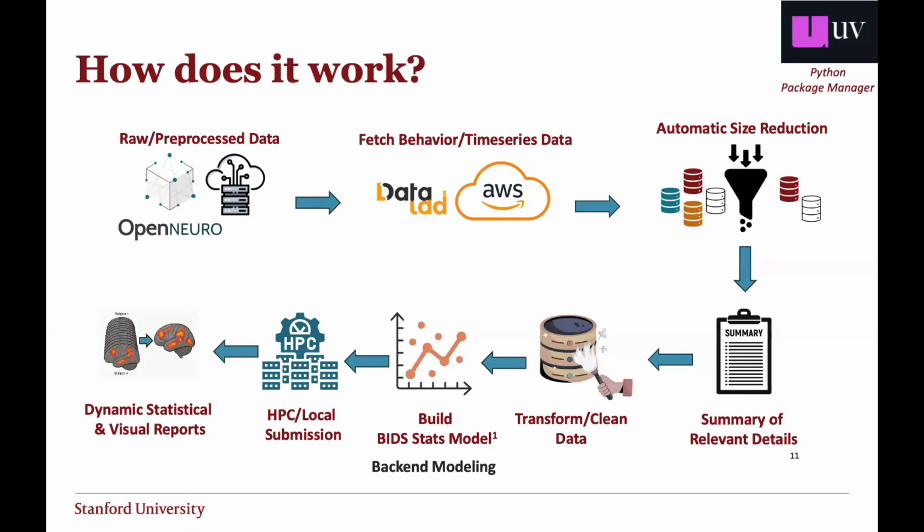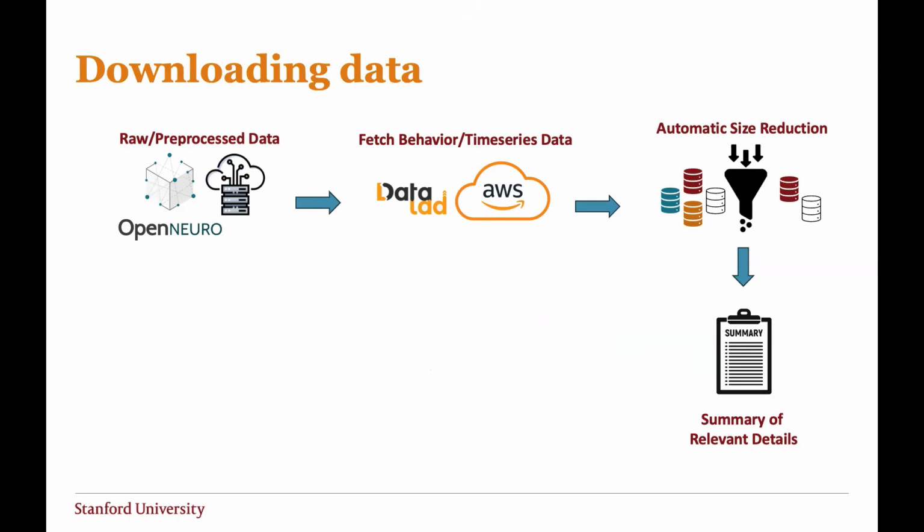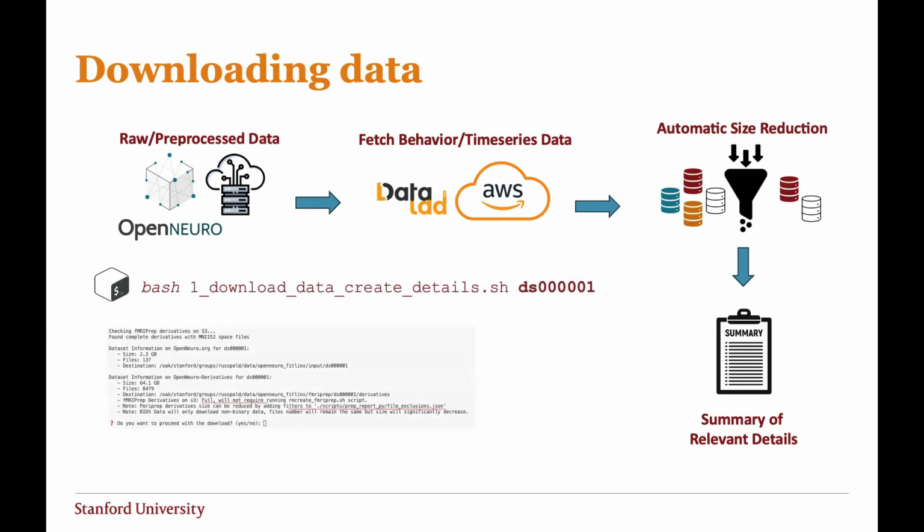So I guess the interesting part is, how does this work? I gave you this loop. What does it actually do? The first step, these 4 components, are actually finished in a single step and one command line, all in one. Effectively, there's this batch command that you simply run. I demarcate them as 1, 2, 3, 4, 5, so it's ordered in structure. And I'll open it to feedback to refactor it, clean it up, make it better, parse them out, etc.